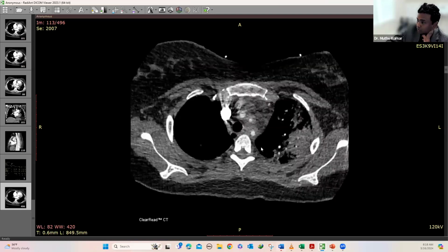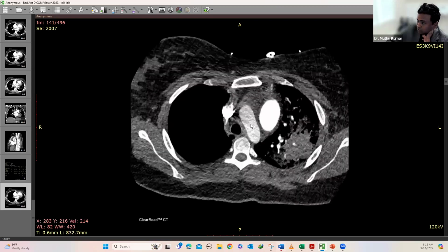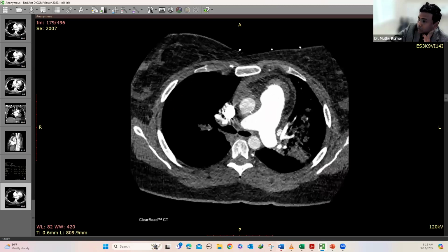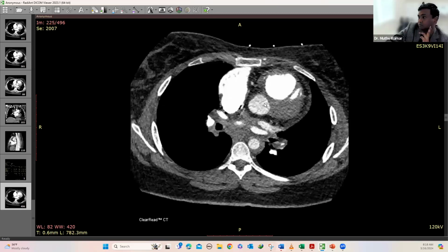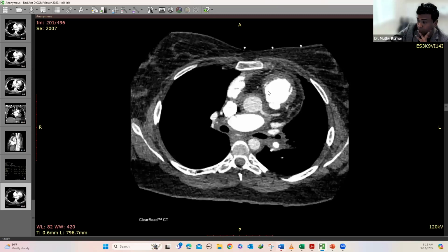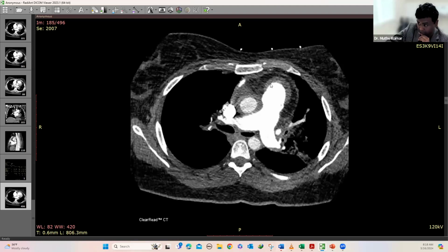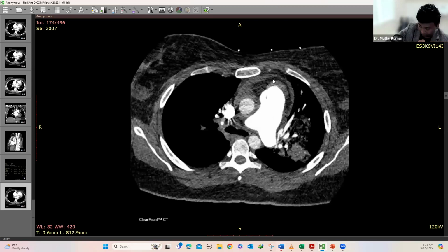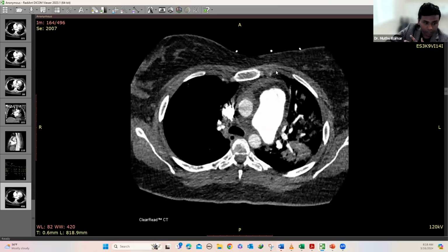And as you come down, the aortic arch is also thickened, and the thickening is extending into the ascending thoracic aorta. By this time, in a 25-year-old female with raised ESR and pulselessness, we are certain what we are dealing with. This is a patient with Takayasu arteritis.